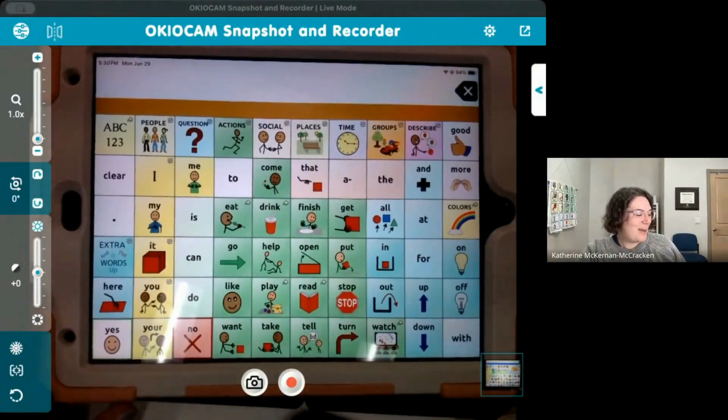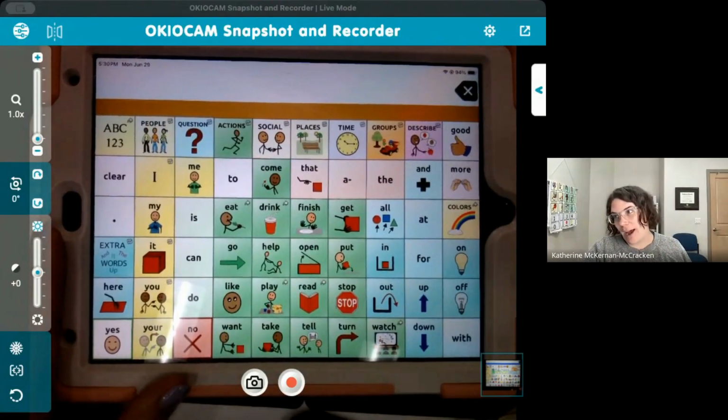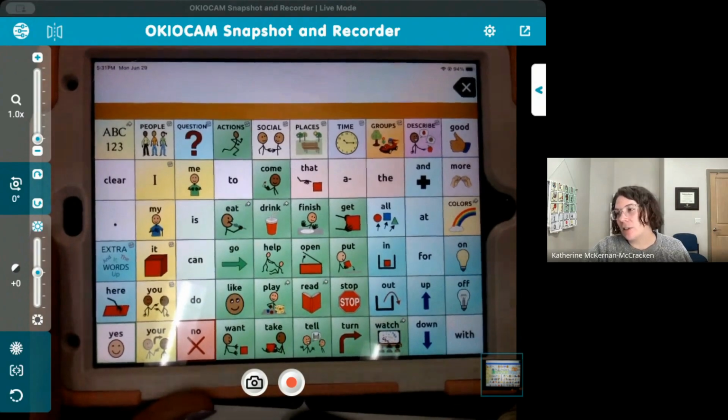We're going to talk a little bit about this speech generating device app, which is called TouchChat with WordPower. On the App Store, there are quite a few different TouchChats. There's TouchChat Discover and TouchChat that doesn't have WordPower. WordPower is a specific version of TouchChat that was developed by an SLP, and it kind of takes some predictive text strategies, as well as some motor planning strategies that some of the other apps use.